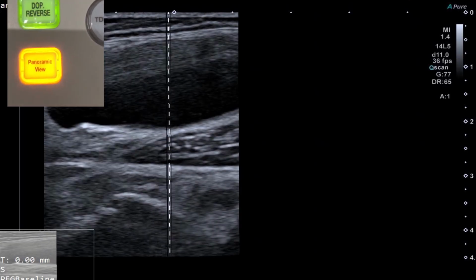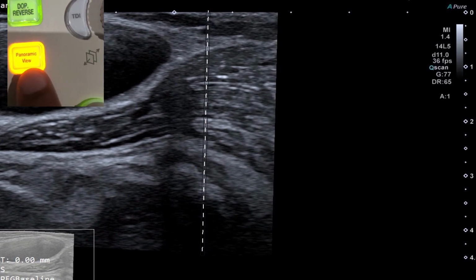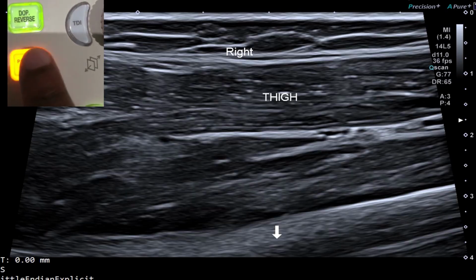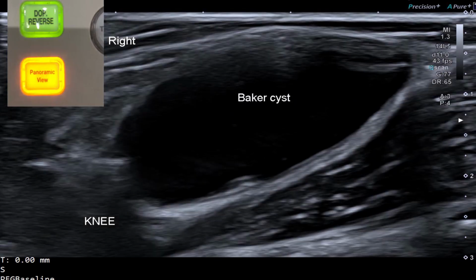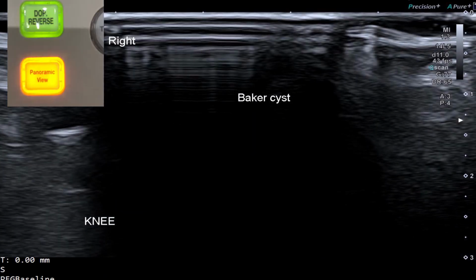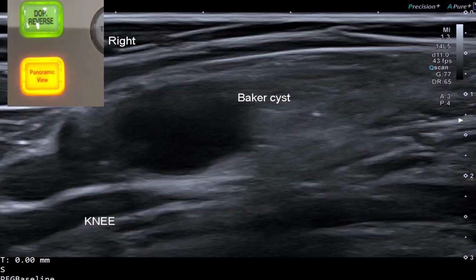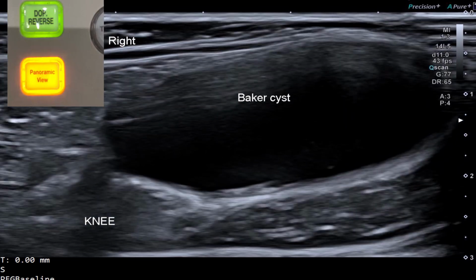to do the examination. So the other challenge there is, if someone is presenting with a popliteal fossa pain, like in this case, it could be very difficult, because if the request form is saying that rule out a DVT, for instance, do not ignore the other incidental findings that you're going to see.